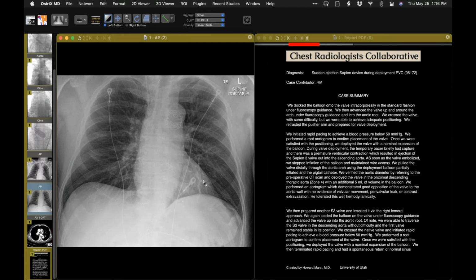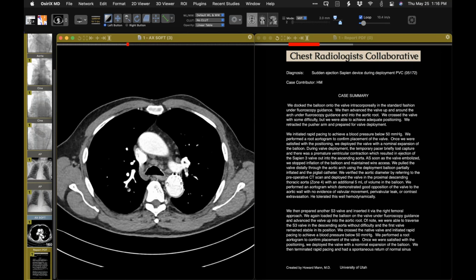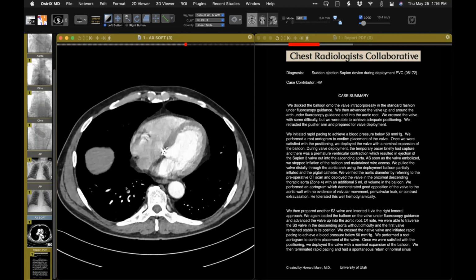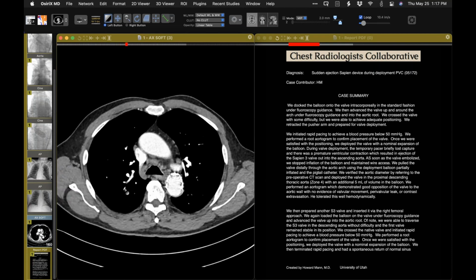If it ends up in that location, it's fine. Does anyone know any differently? No, this one is what I've seen here. Exactly as you said, they just move it so that it's not blocking the arch vessels, because sometimes it gets lodged there when it embolizes, but once it's past that, they just leave it.